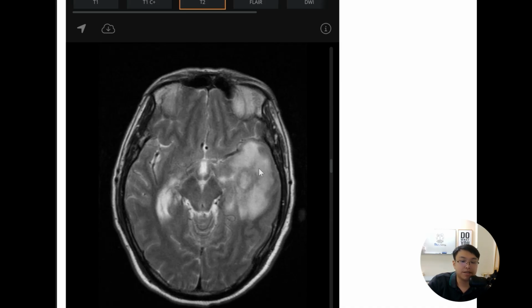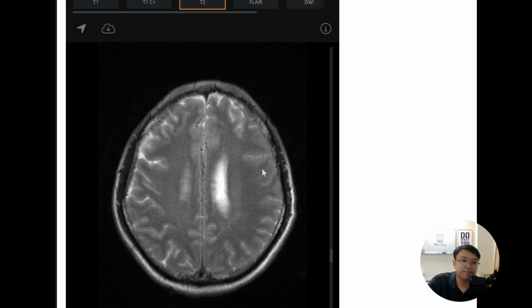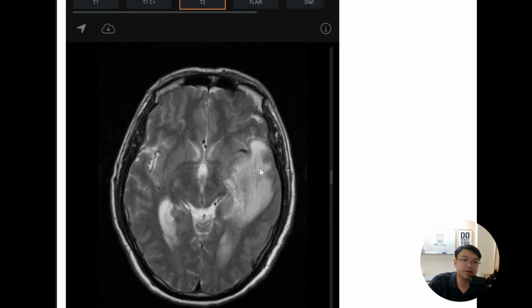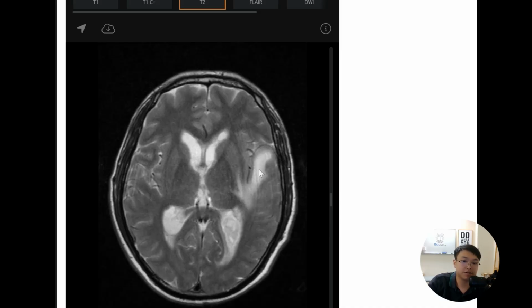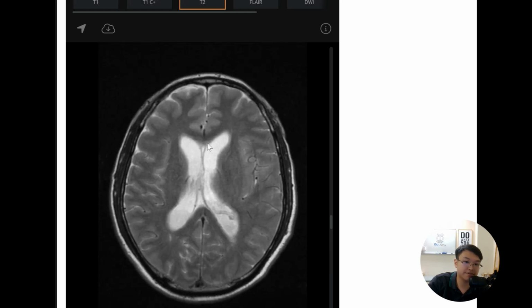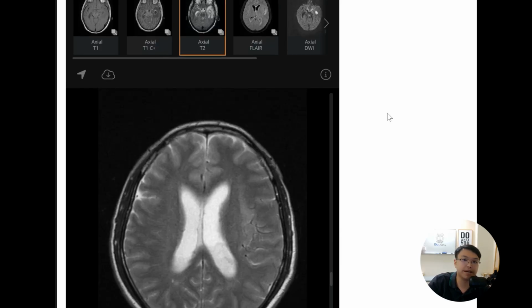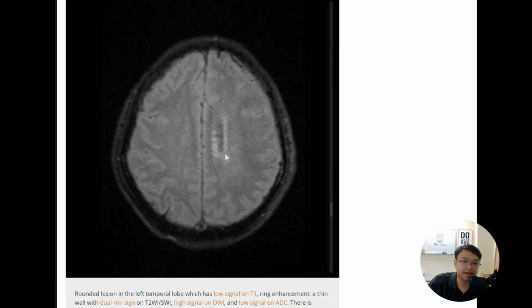But even though it is very commonly mentioned that, okay, white matter edema are vasogenic edema, but mind you, okay, it only sneak through some loosely packed white matter tract. The closely packed corpus callosum can never be, okay, be sneaked through by the vasogenic edema. So whenever you see some so-called mass effect or edema signal across it, they are not vasogenic edema. You need to consider possibility of pathology that can target, okay, the corpus callosum, for example, tumor infiltration of GBM, okay, but it is not happening in this case.